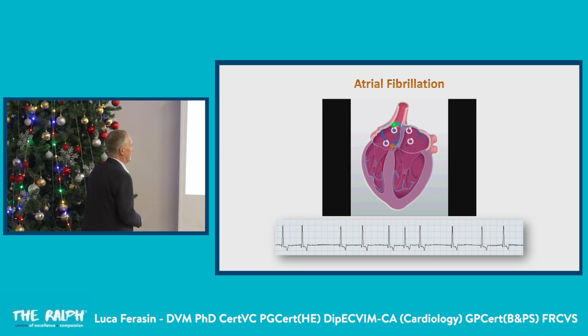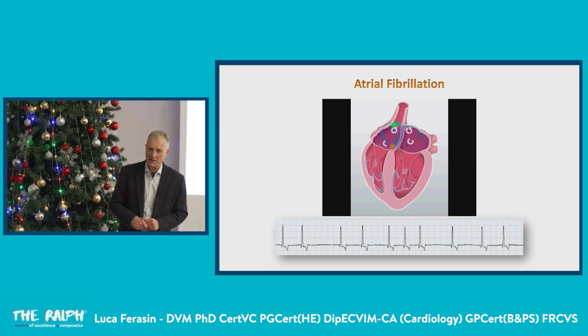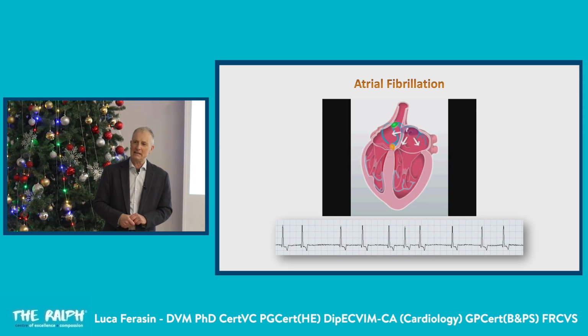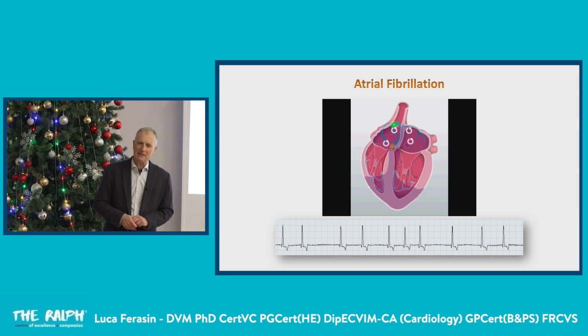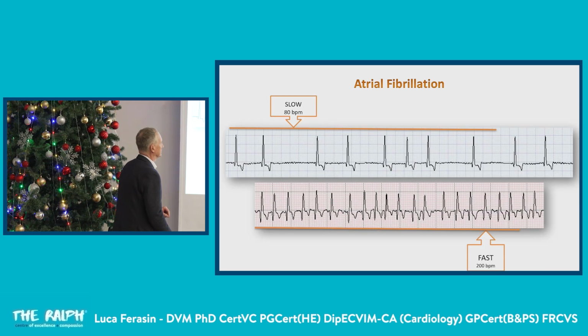Now, this is a case of so-called lone atrial fibrillation or slow atrial fibrillation, which is not very common. We see sometimes this in giant breeds, but as I said, not very common. What we see more often is this one.